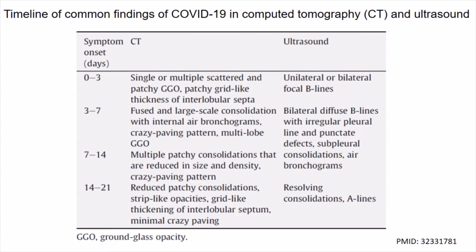Infiltrations detected by lung ultrasound can be suggestive of pulmonary edema, infarct, or lobar pneumonia. Nevertheless, a confirmed diagnosis of either of these findings requires a complementary imaging modality such as chest CT.